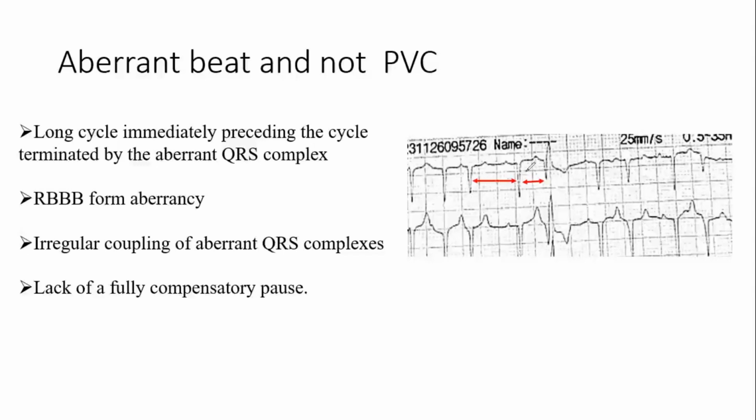It can still be seen in atrial tachycardias, as you've seen in this case; this was a real patient. More commonly, atrial fibrillation will give you this because there are a lot of conduction issues, aberrancies and delays, and multiple phenomena going on. But mind you, it's not always AF. We have seen that in this case.